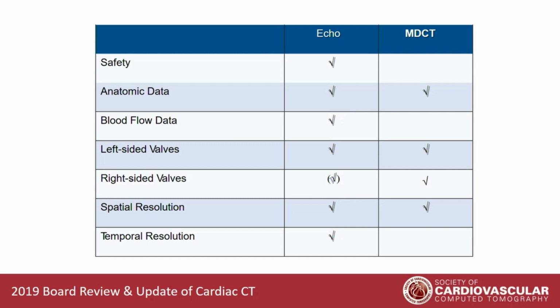But when you think about the anatomic milieu, the environment, the cardiac skeleton that the valves live in, CT does a pretty nice job, right? Volumetric acquisition, isotropic voxels, the ability to orient in any plane after the patient's gone home. There's a lot of anatomic detail that's available on CT. That's a real strength of the modality.